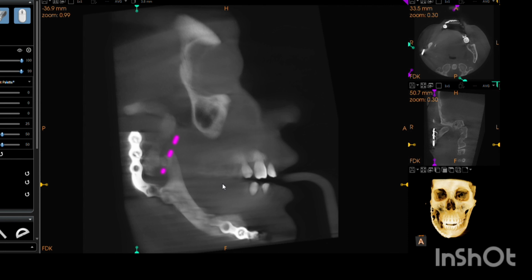Now this is a fracture line. There has been a fracture in the ramus of the mandible. So I'd say there is an oblique fracture, which runs anteriorly from the level of mid height of the ramus and posteriorly to the base of the ramus. This is the base, and this is the mid height. So there has been a fracture.